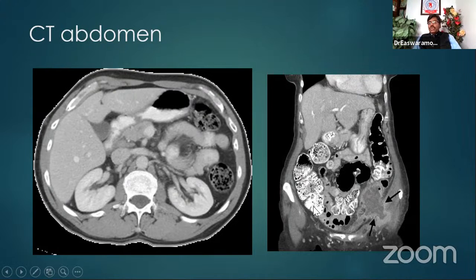And this is another view, coronal section, the stomach nicely seen, body, antrum, pylorus, large intestine, descending colon here on the left side, ascending colon with the contrast nicely seen, and you can see some diverticular perforation with abscess going to the anterior abdominal wall. See, this amount of understanding you can have only if you have various sections and various interpretations. So you can put the anatomy.